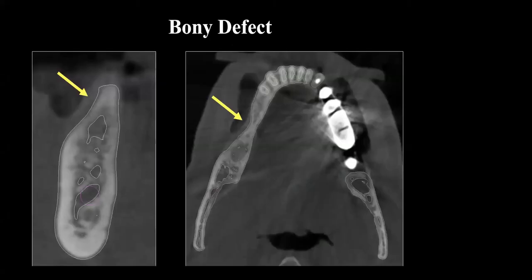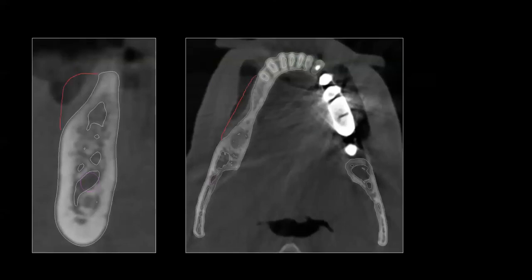Number 1, trying to surgically place the implant into this thin bone is very difficult. What a lot of doctors do is they'll start drilling in the very coronal aspect of this, and then because the burr width is wider than the available bone, they'll end up drilling too deep. And guess what's too deep? You have the nerve there. So you have to be very, very careful.